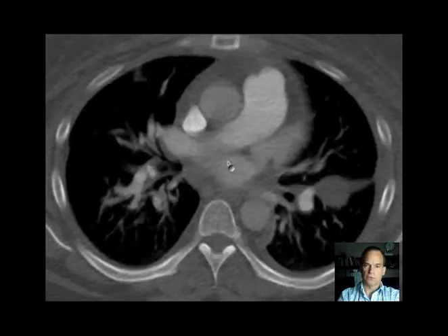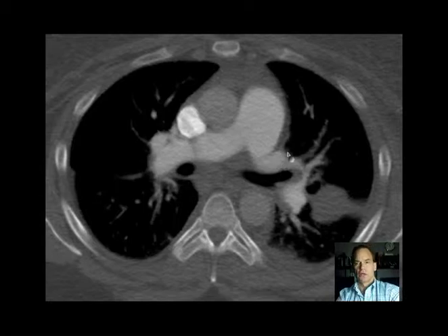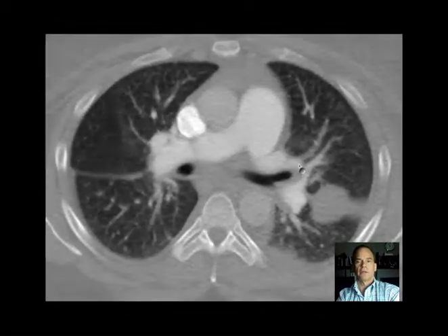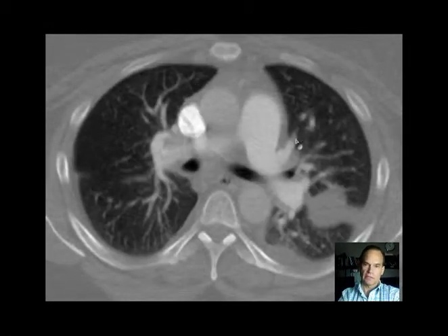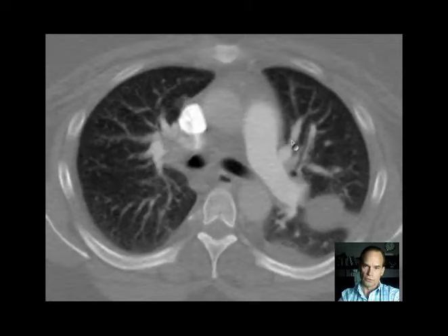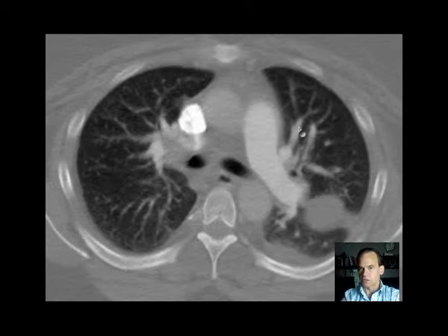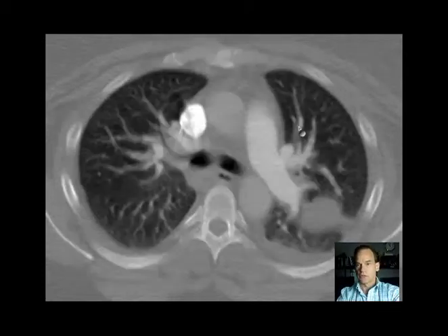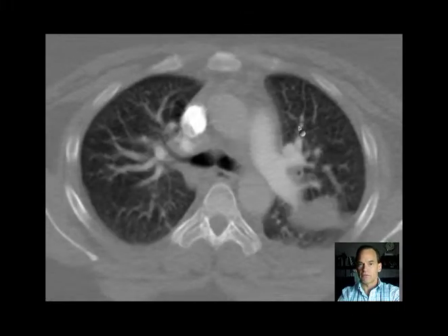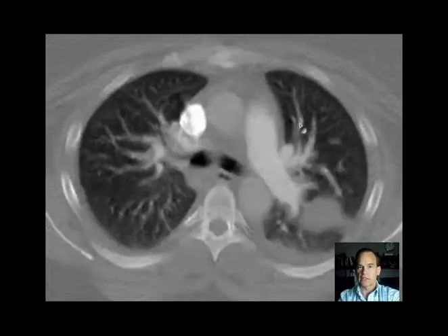So here we have the left atrium, and we go up. So this is a main pulmonary vein coming from the upper lobe. Let's see if I can window that a little bit better. That's a pulmonary vein there. And if we go up, we'll see that this is one of the branches from the left upper lobe draining into it. So this is a pulmonary vein, and even though the patient's lying down, this part is up higher than this part. So it takes a fair amount of back pressure to make this venous structure, and some of these other ones here, some of these are veins too, distended like this.